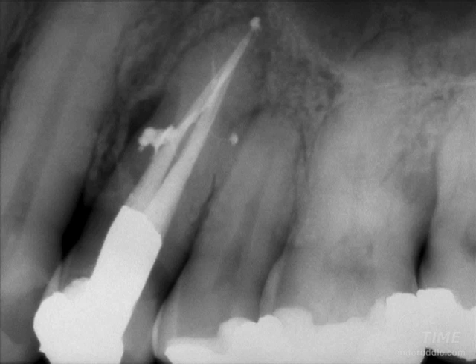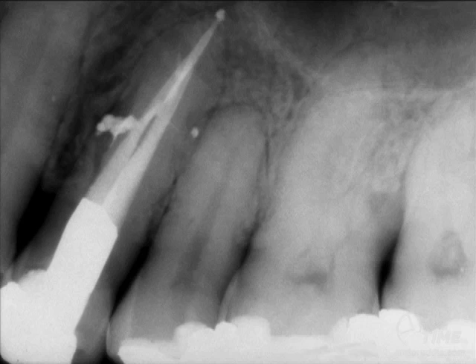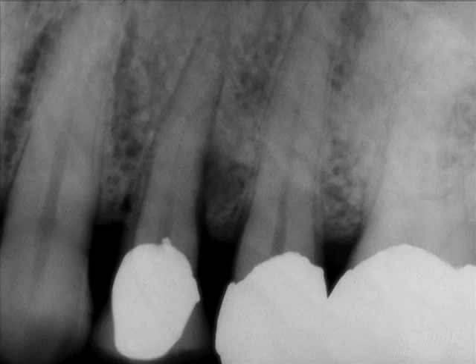And through active irrigation, we can remove pulp tissue, microbes when present, and this gives us the opportunity to fill root canal systems in 3 dimensions. Notice 20 years later how tight that bone is around the periodontal ligament space of the tooth that we've just treated. Another bicuspid tooth, if you look very carefully, there's a large diffuse distal crestal lesion of endodontic origin.